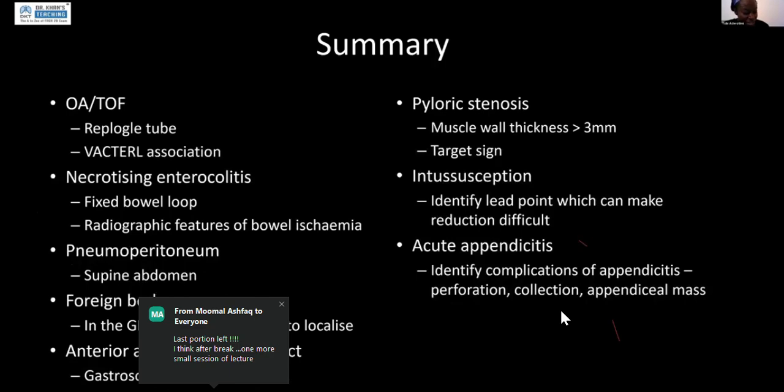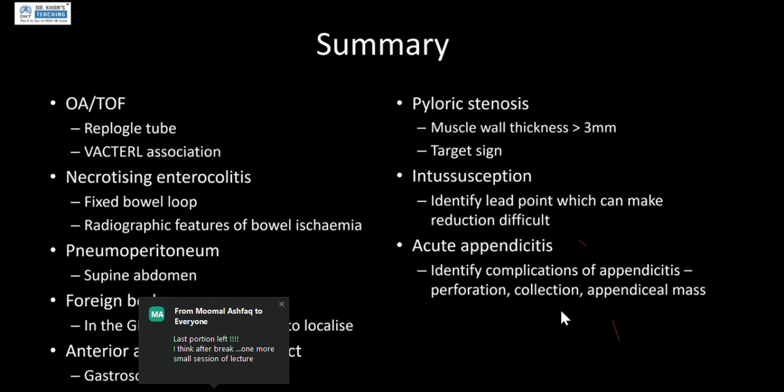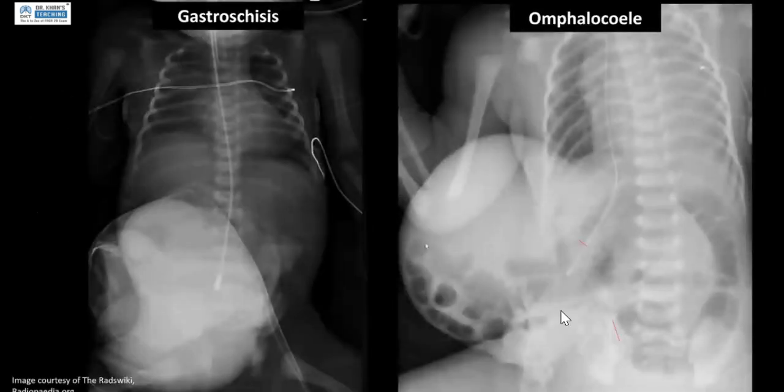All right, I've been talking for ages. And also there's one more thing. So in gastroschisis, because it's just bowel, right? Often, I think in one of the pictures that Toby has, they also put what we call a silo. So it's just a plastic covering over it, which can make it hard to differentiate between omphalocele. Of course, you can also look for what's herniated within. So if you've got more gas-filled bowel loops, there's bowel, and in omphalocele, there's a bit of liver. So it can be easily said, there might be something else other than bowel. The other thing that they might want you to do is an ultrasound to see exactly what's herniated, and you can help to characterize it further. Oh, I've never had to do an ultrasound, so that must be a Sam thing.